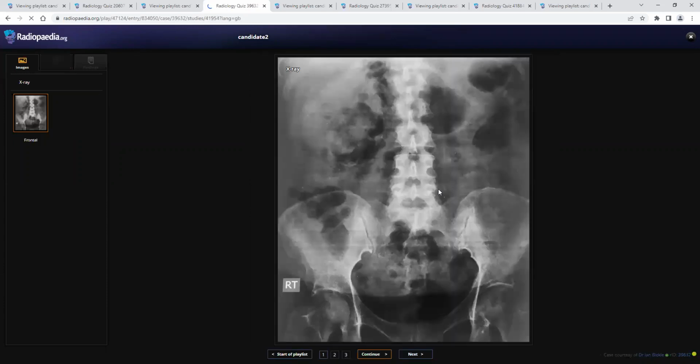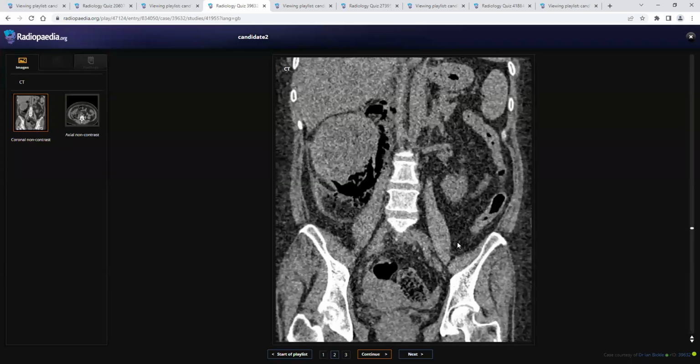And the previous one, this is your first case, and you picked up very well. This is the shadow in the right lumbar region, and you rightly asked for the history of diabetes, because emphysematous cholecystitis, emphysematous pyelonephritis, cystitis, all are common in diabetic patients. And this has to be acutely managed in an emergency setting. Okay. Good. You did well. All the best. Thank you.